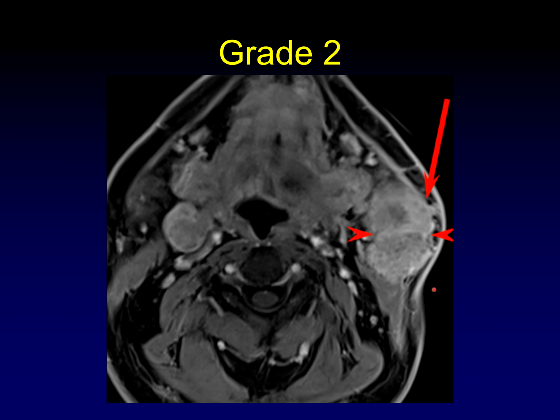Do we have the loss of an acute angle? Yes, there may be an acute angle on this side, but on this side, that acute angle is lost and flattened. So that is grade 2 adenopathy. You may think, is this even grade 3? Have we gone out all the way to the skin? Well, I don't see skin thickening here. You may claim that there's some invasion there, so maybe possible or probable, but there's definitive grade 2.